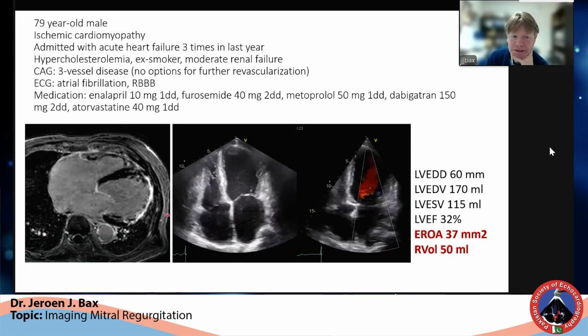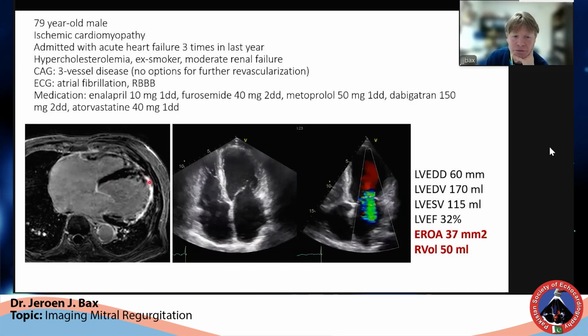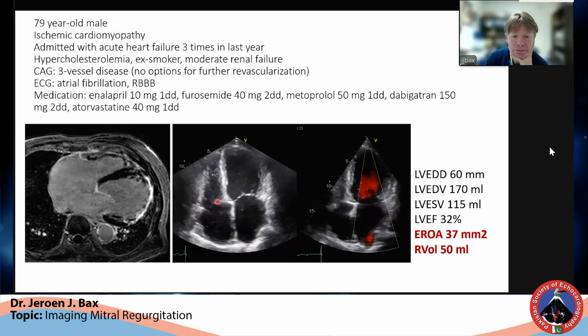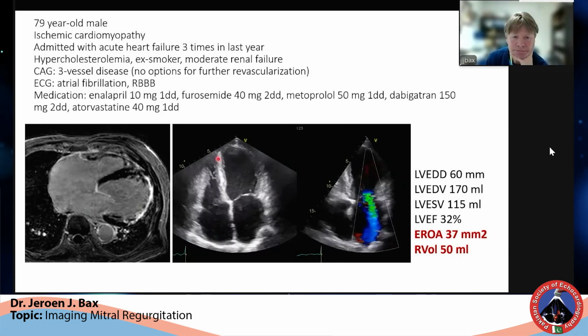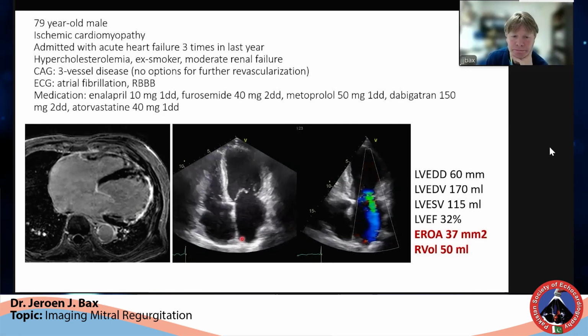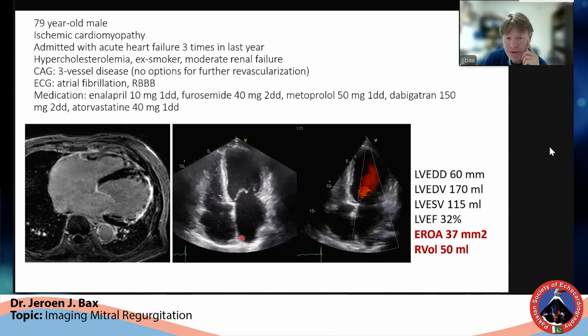This is the MRI of the patient. We see a dilated ventricle, and there is scar in the lateral wall. That's an old infarction. Here I see the echo. This is where the scar is. It's not moving. The atria are enlarged. We learned about that in the previous talk about the tricuspid. The same goes for the mitral.